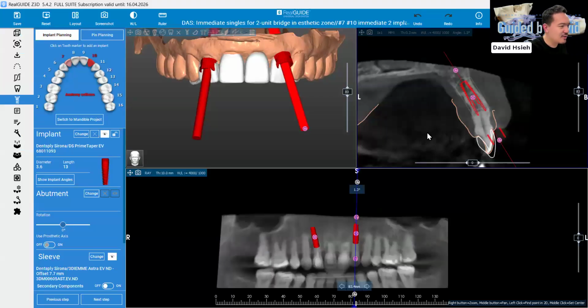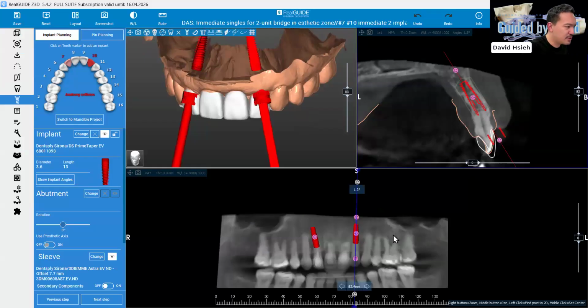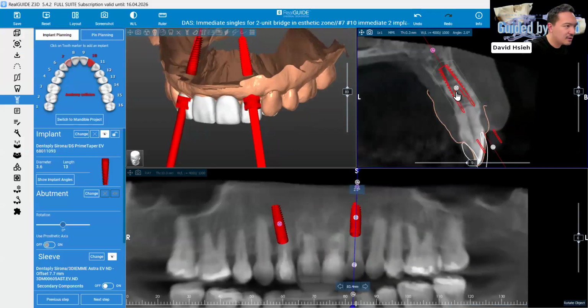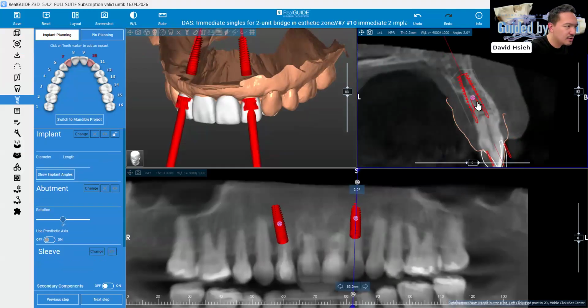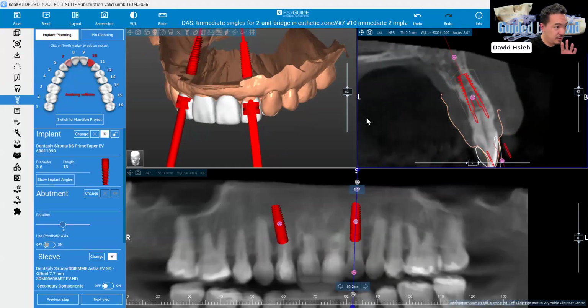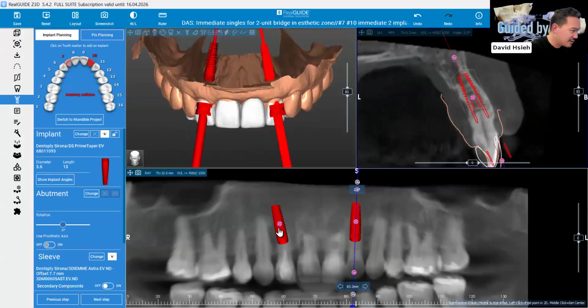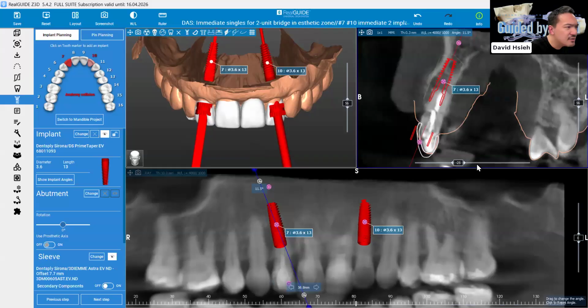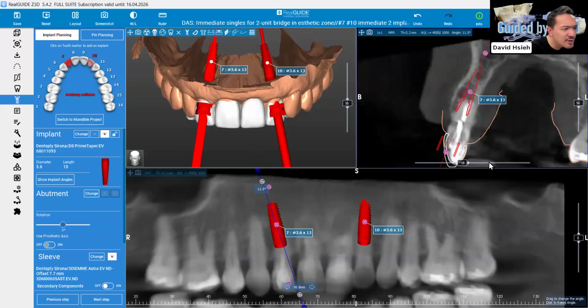All right, cool. So we have our implant in position, right? And then knowing all our, so the position for that. The bone at number 10 is not the best. So let's start working on number 7 first. Number 7 is kind of more user friendly.